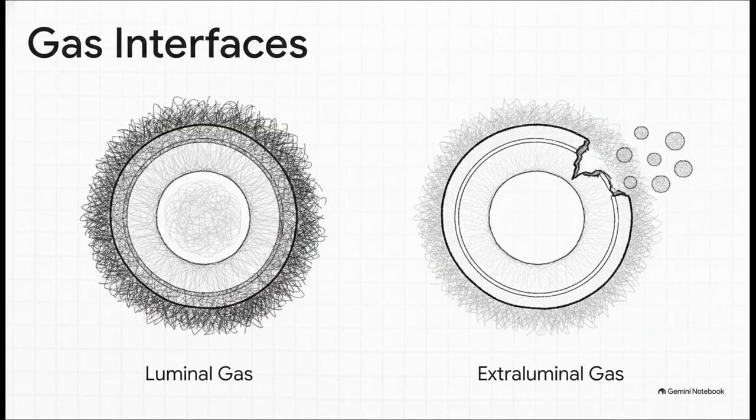Normal intraluminal gas only outlines the inner mucosa of the bowel. But extraluminal gas from a perforation creates an entirely new interface that renders normally invisible ligaments sharply visible. Think about the physics here. The outer surface of the bowel normally rests against soft tissues of identical radiodensity, so it's completely invisible to us. But when a hollow organ perforates, free air escapes. This dark radiolucent gas creates a stark new border against the bright radiopaque soft tissues, suddenly highlighting the outside of structures.